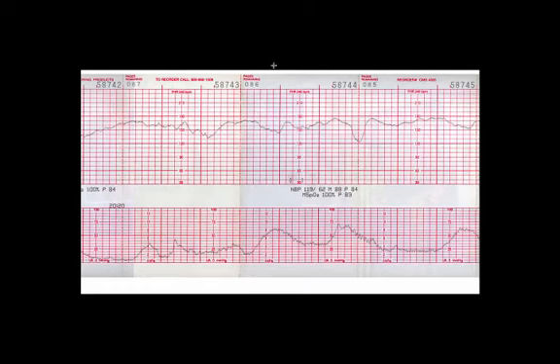But you want to just be aware that maternal and fetal strips, as you read them, it can be difficult to make a clear determination of what's happening, and sometimes you need to say that this is a baby I need to watch a little more because I'm not exactly sure what's happening. We have minimal variability, so perhaps not well oxygenated. We have a wandering baseline, so the baby is having a really difficult time keeping its heart rate in a specific area. We have a variable deceleration. We don't have accelerations. So this is not a reassuring fetal heart rate strip. This is one to watch more carefully.